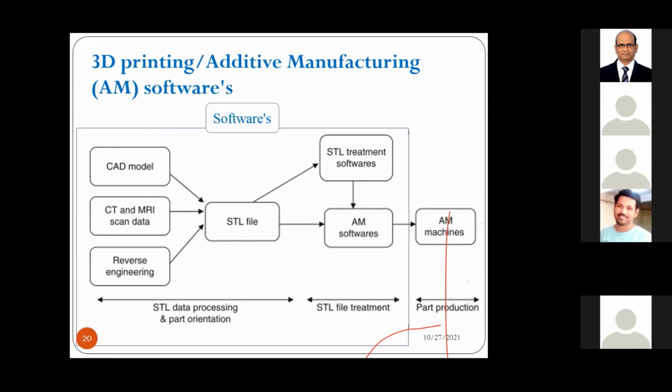When we are doing medical CAD modeling, or some architectural model, these problems will arise. When we are using a normal CAD model, you can't see these STL problems in any way, because the CAD model follows exact rules. But when we are doing the medical model or some architectural model, they are not following any rules. The total data is different.